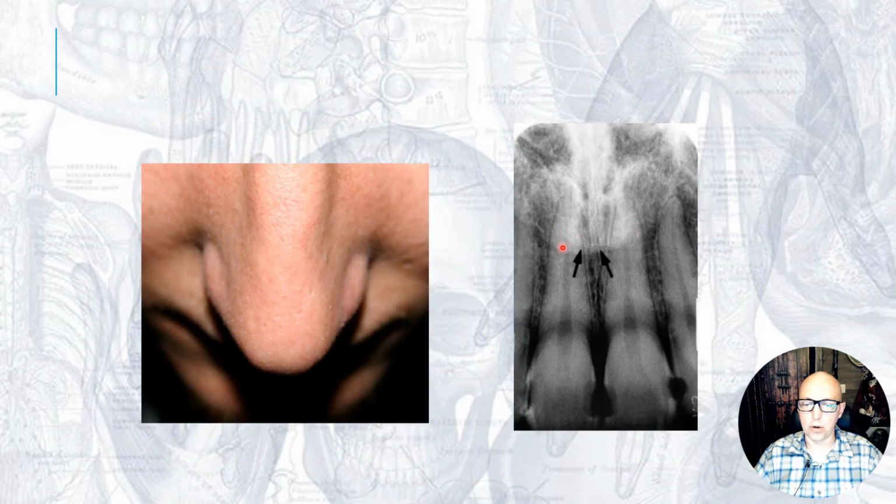Okay, if you look at this radiopaque structure and you start thinking, okay, is it a cyst or a tumor or something, or is it an osseous structure? All those things will have a cortical outline around it. One good way to tell that it might be, at least it might be, a soft tissue structure is there's no cortical outline around it. It's pretty much uniformly radiopaque. Sometimes these soft tissue structures can be fairly thick and dense, and so they can block out some of the radiation and appear fairly radiopaque.